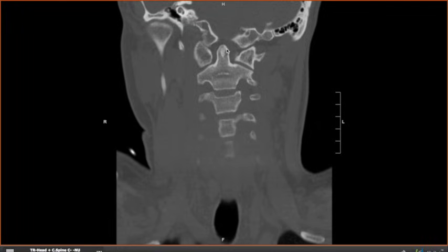The alar ligaments are thick, horizontally directed ligaments, running from the lateral tip of the dens to the anterior medial part of the occipital condyles. As a quick pearl, if you're going to remember any of these ligaments, it's the alar ligaments that we just discussed. The alar ligaments will come up again and again.